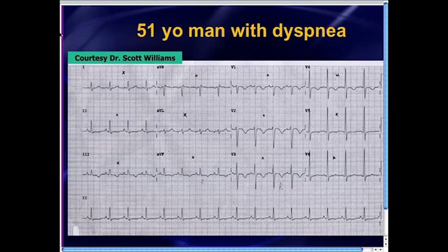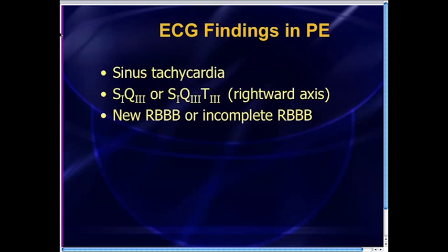And what they noticed on this EKG was a bunch of T-wave inversions, which at first glance would make you think that this patient's shortness of breath is due to diffuse cardiac ischemia. However, they knew a little bit more, and what they were able to diagnose based on this EKG, the presence of T-wave inversions in the anteroseptal plus the inferior leads together. Turns out, as we've talked about before, that EKG abnormality is very highly specific for pulmonary embolism. That's what this patient ended up having.